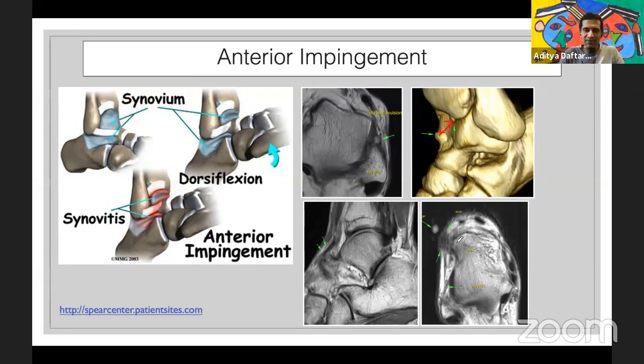But more commonly, you have some scarring that tends to happen anterior to the talus, as we talked about when looking at the anatomy, which can encase the anterior neurovascular bundle and impinge on the extensor digitorum tendon to produce anterior impingement, which could be neurovascular or tendinous. And then sometimes you can have a small bony avulsion, which can also produce mechanical obstruction or mechanical locking in the anterior lateral recess of the ankle joint. So anterior impingement can happen because of bony changes or can be neurovascular in its appearance.